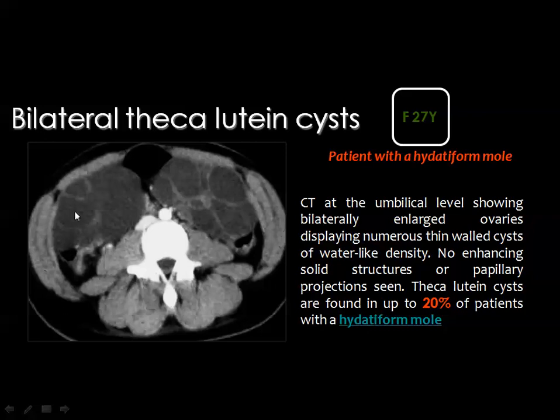You see both ovaries are markedly enlarged. They contain a lot of cysts of sizable, large size, and you see some ovarian tissue in between.